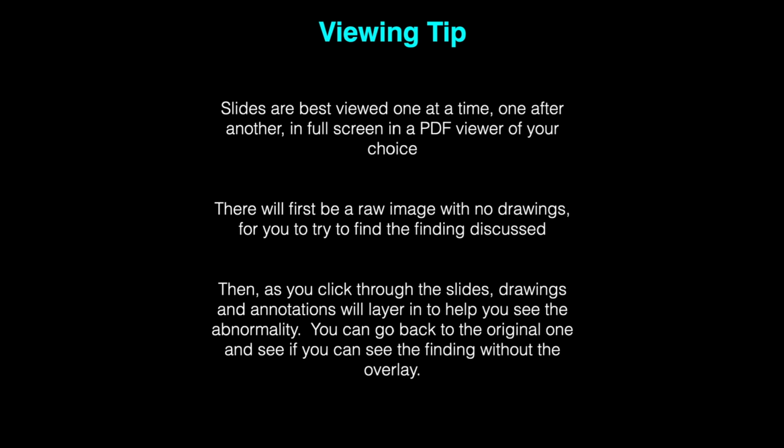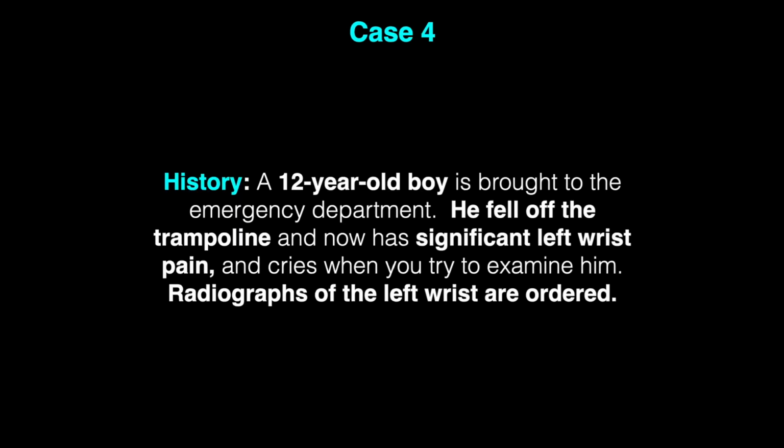After watching this video, the learner should be able to, number 1, identify the carpal bones individually on a radiograph. Number 2, recognize scaphoid fractures on a radiograph. And number 3, recognize the features of gymnast wrist on a radiograph. Let's start off with the first case.